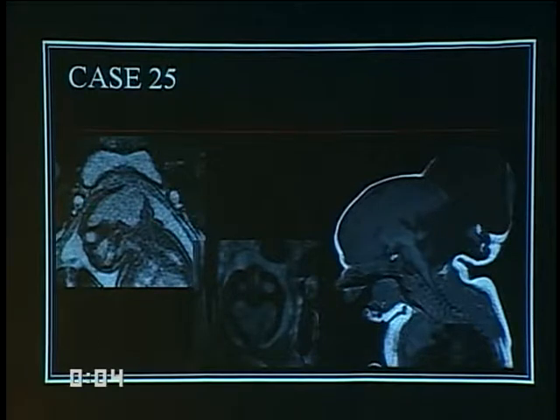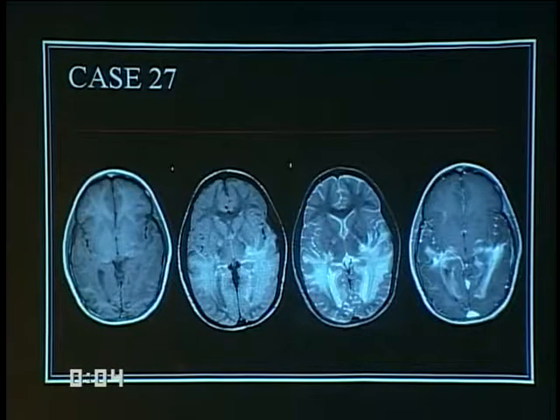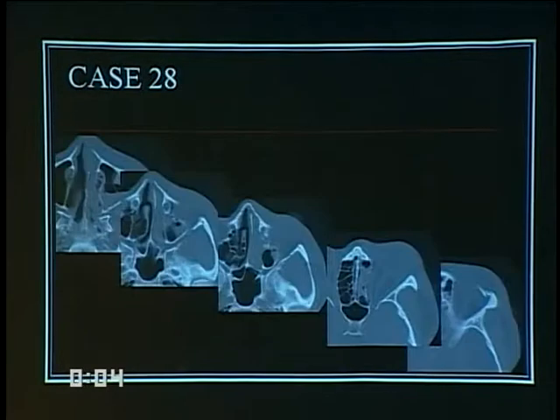I just did this fetal case last Friday. This is all the same patient. There's at least one finding on each image.